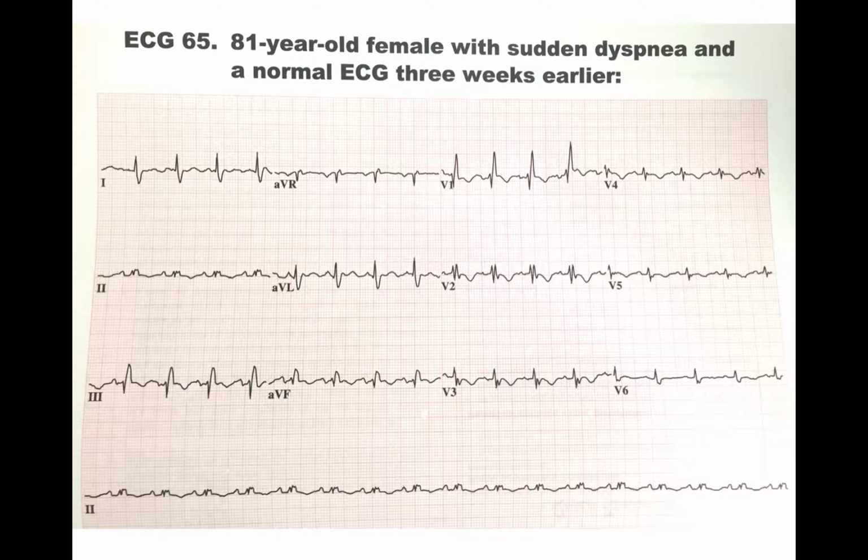So in this patient, expecting the PE, you would want to look for characteristic ECG abnormalities, the first of which would be sinus tachycardia. So taking a look at the rate, as we've done in every video so far, and using our big box method, 300, 150, clearly over the 100 threshold for tachycardia.